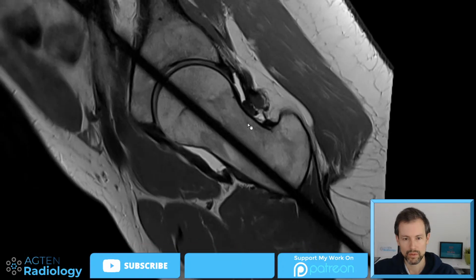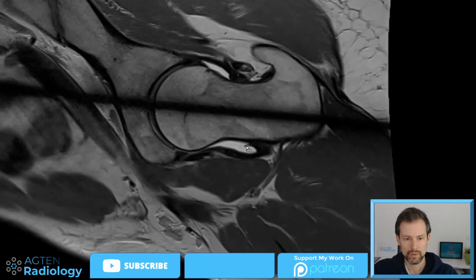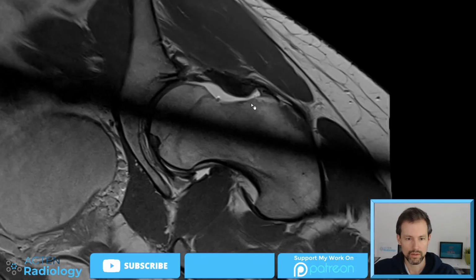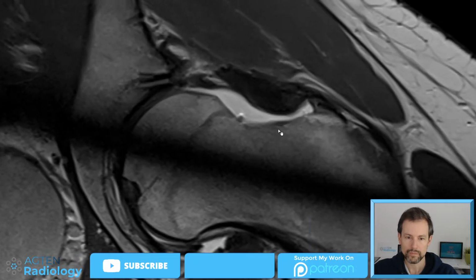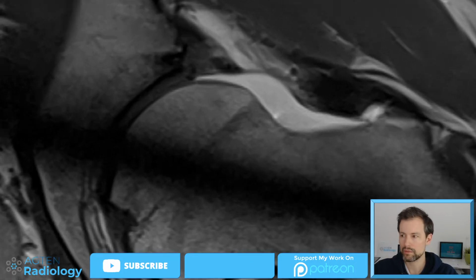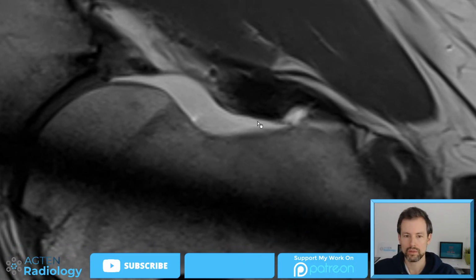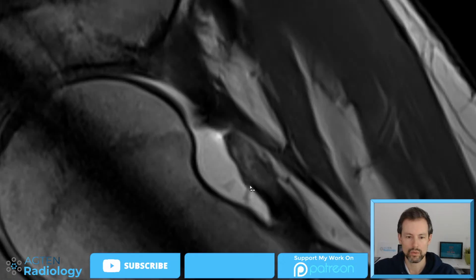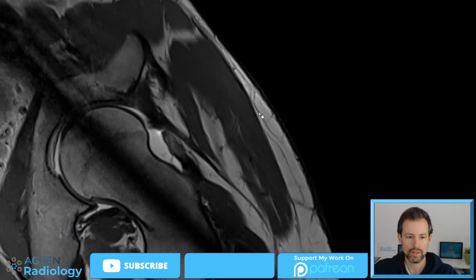So still gluteus maximus, and this is now more laterally. Here are some very subtle changes. This one, probably one of these, was one of the adhesions that he mentioned. Go bigger. This one, and I'm not really sure whether we can see any more than this.